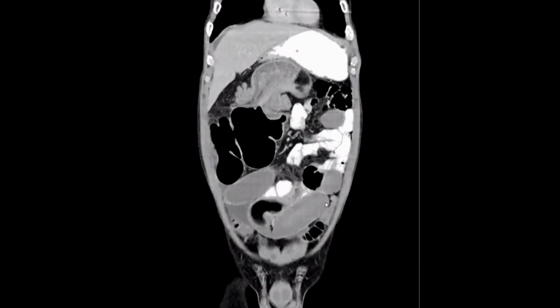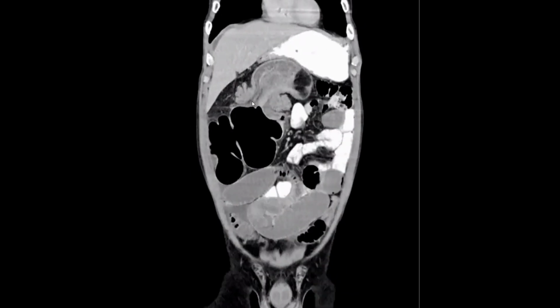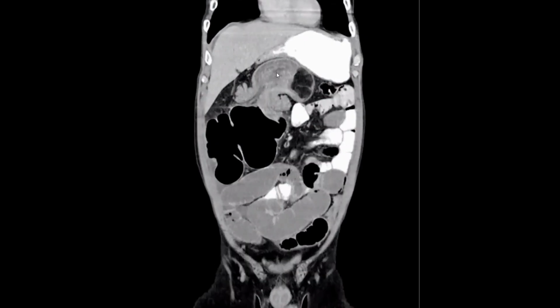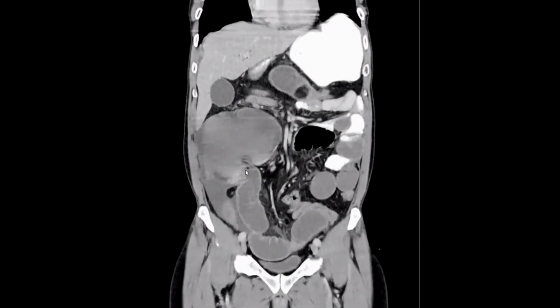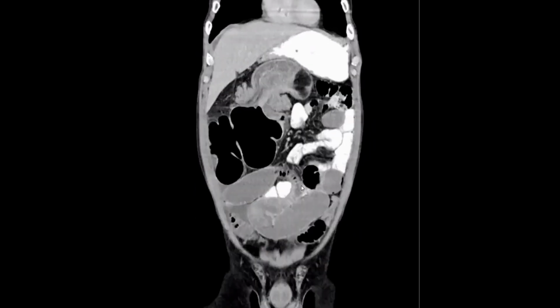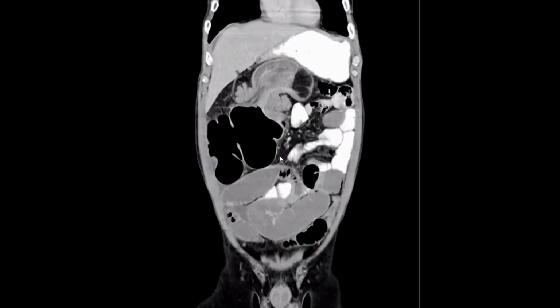This is a coronal plane. Look for this one. This is the lipoma, and look for the mesenteric vessels. Look for the bowel loop here. The bowel loop and even the mesenteric vessels and mesentery are going inside the transverse colon, with secondary marked dilatation of the cecum and dilatation of the small bowel loops. Okay, we don't have any perforation. Thank you.